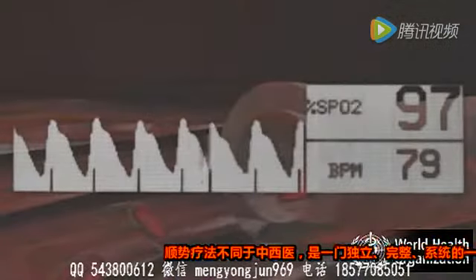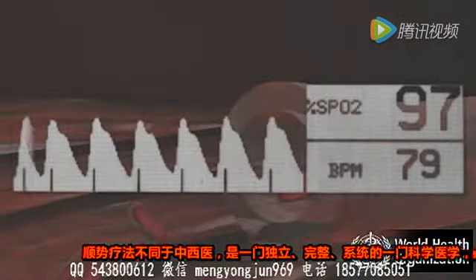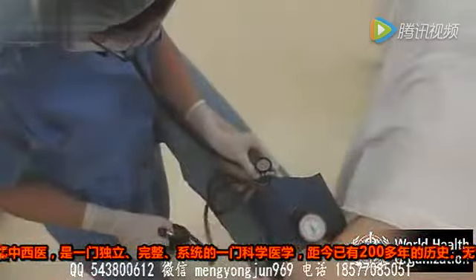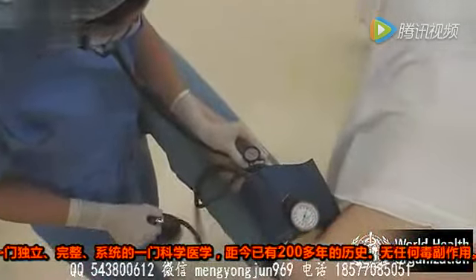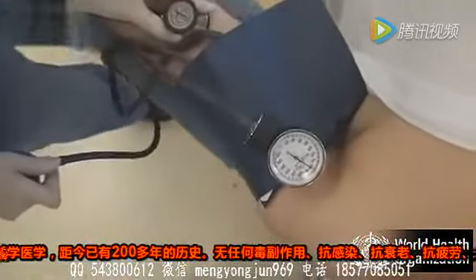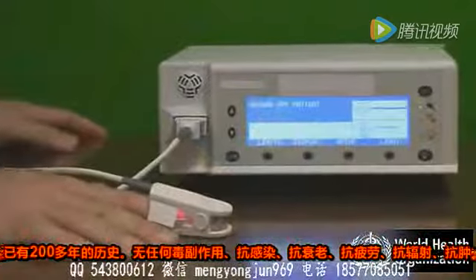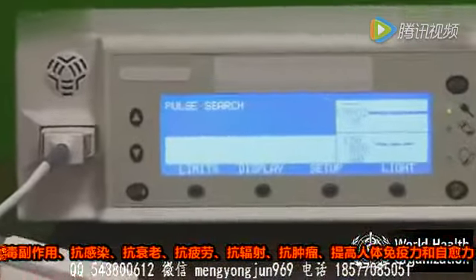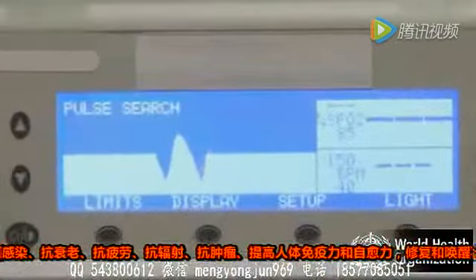Pulse volume. The oximeter only detects pulsatile flow. When the blood pressure is low due to hypovolemic shock, low cardiac output, or cardiac arrhythmia, the pulse may be weak, and the oximeter may not be able to detect a signal. Restoration of a strong pulse will correct this issue.